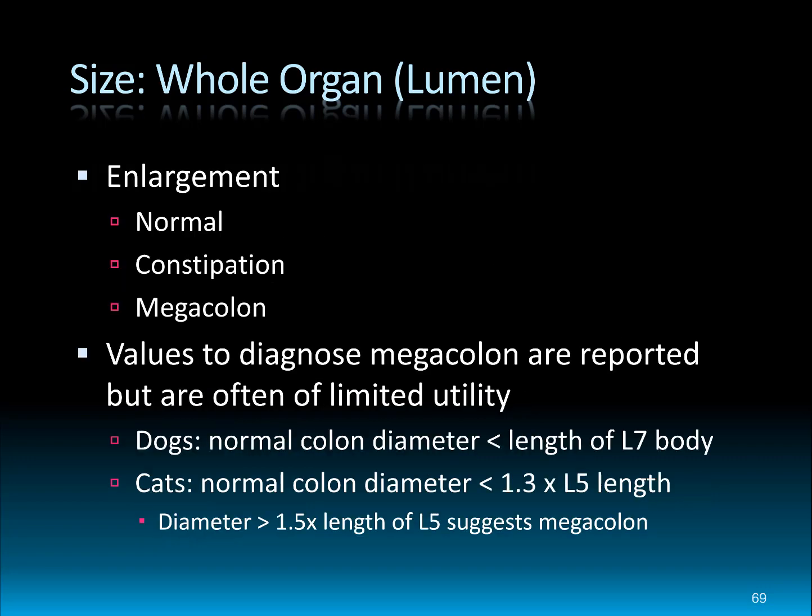If there's a possibility that the colon is big, you have to decide if that might be normal for this patient under the circumstances, or if it's constipated, or if it may even represent a megacolon or pathologic enlargement of the colon. As far as diagnosing a megacolon, we do have some measurements that are used, although their utility is variable, or at least maybe somewhat limited.